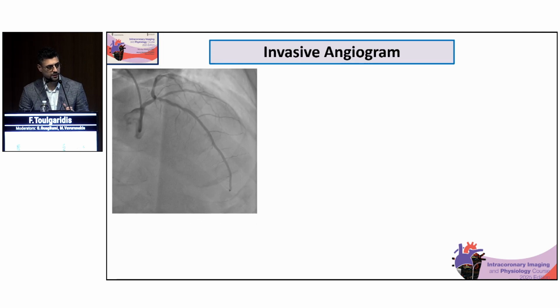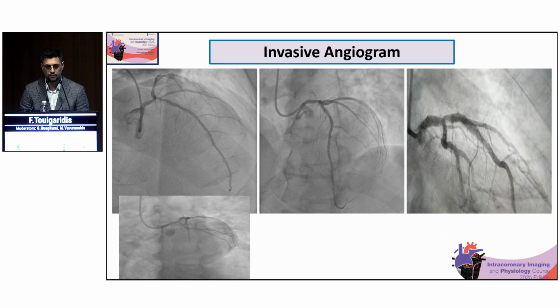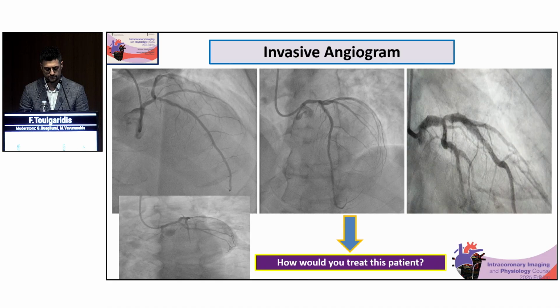So based on the acquisitions and the images, how would you treat this patient? To say our point of view, we really thought... This question to the panel? Okay. I think the first question is whether we know exactly the lesion. So who from the panel wants to talk about the exact location and whether they need more information? Pavlo, do you want to start this?